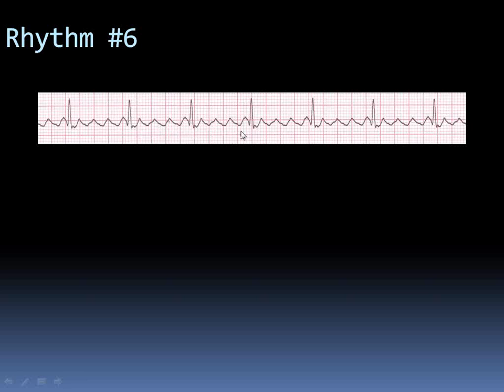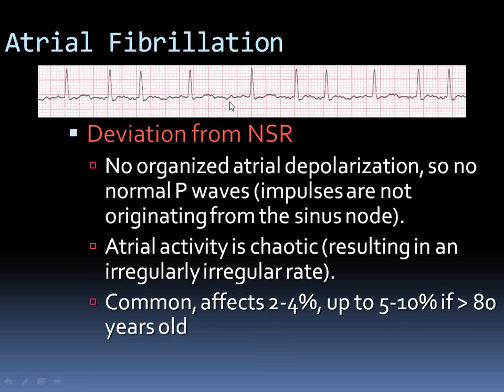Okay? So this is atrial flutter because the atrial rate, if you measure, is almost one big box only. So this is 300. The distance between this spike and this spike is only one big box, which is 300 beats a minute. So the P waves are very well formed. They are regular and they have a shape to them. This is atrial flutter. The QRSs are mostly regular and you do not have a wavy baseline as compared to this, in which the baseline is all over.